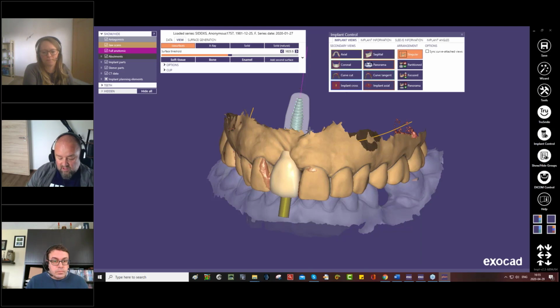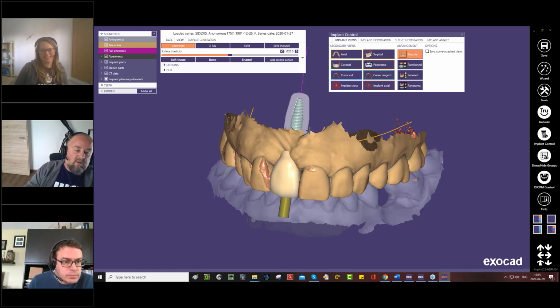Another interesting question. Somebody is asking why sometimes features from the DentalCAD are not available here. For example, now you were able to copy or mirror the other tools, but in exoplan you were not able to do that. The reason why not, you explained that already during the demonstration. Yeah, but maybe now you can repeat it again.